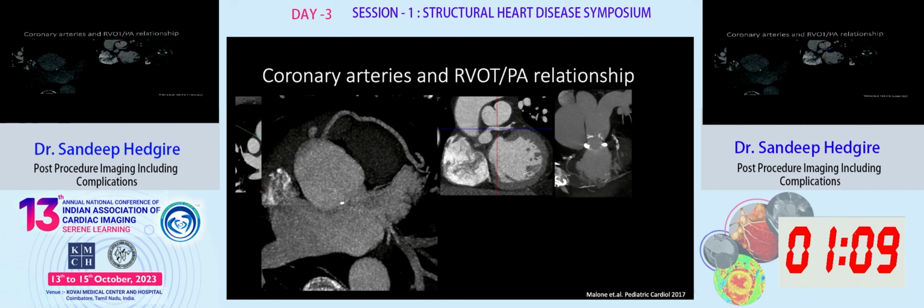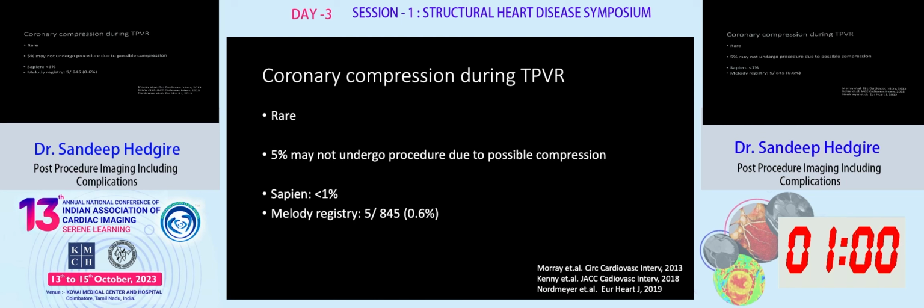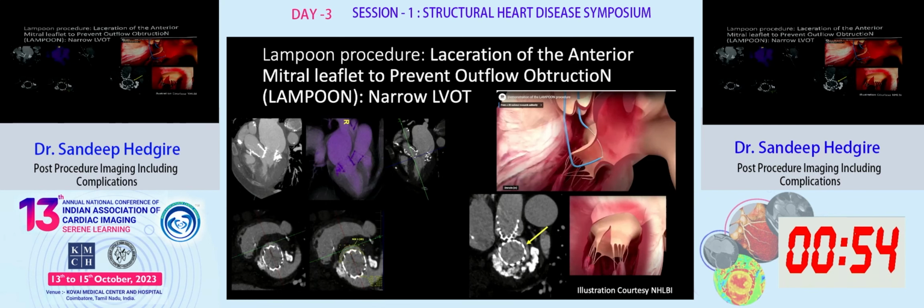This is a patient who has a pre-pulmonic course of the left coronary artery, and this is something that you do want to mention in your report. So as I mentioned, this complication is rare, and with both the SAPIEN as well as the Melody registry, the rate is very low.